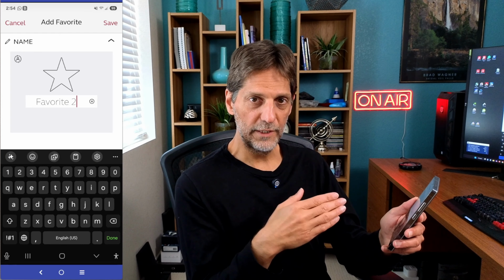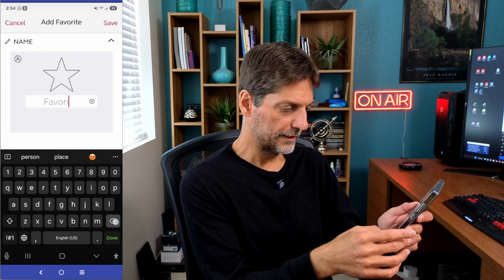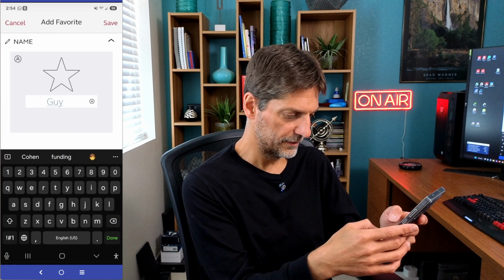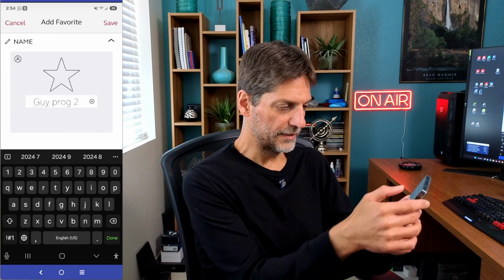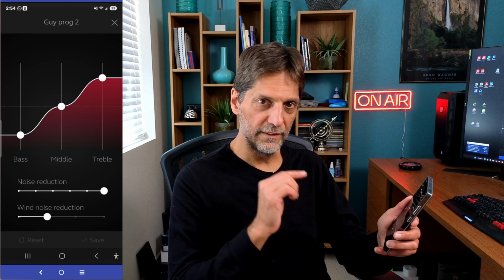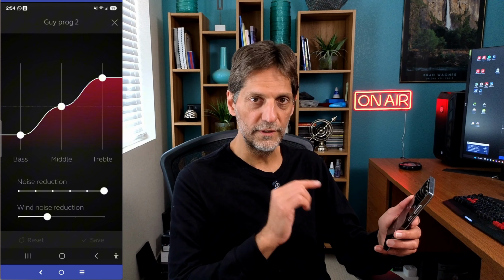I will now give it a name, and I can name it whatever I want. I'm just going to say Guy, and I will save it. And now, whenever I want to move to these settings exactly, I can just choose that program.